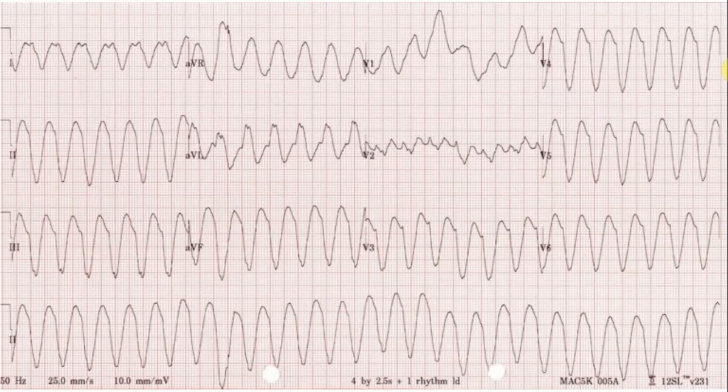However, if there is an elephant in the room, that does not need an introduction. The elephant in the room in this ECG is a wide complex tachycardia. I will come back to it in a second. Let me talk you through the usual stuff at first. The ventricular rate is 150 beats per minute. The rhythm is difficult to evaluate as I can't see any P waves. The axis of the QRS complexes is northwestern axis, which suggests ventricular tachycardia.